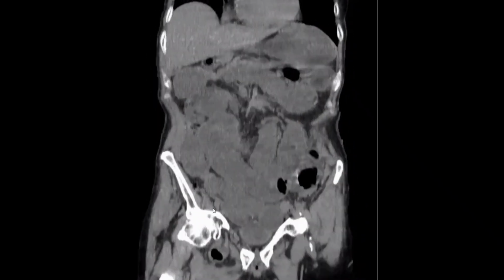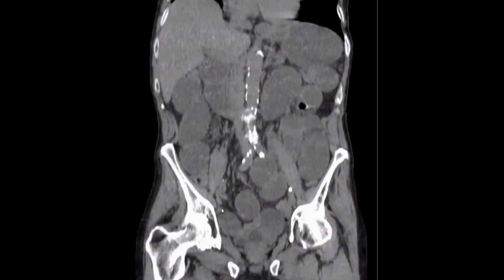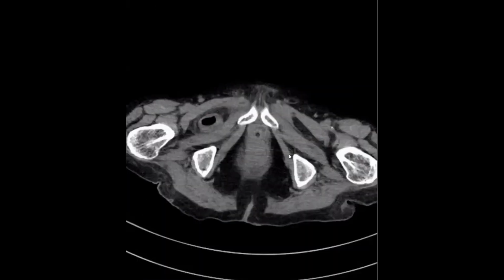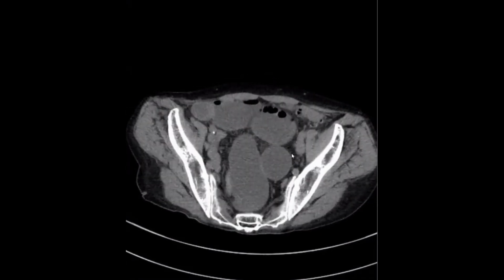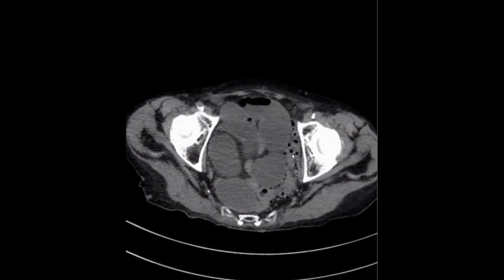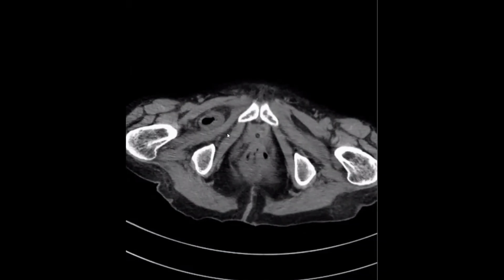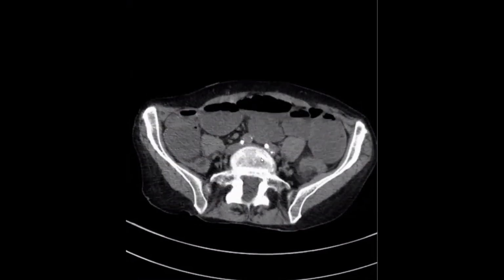So you have here small bowel obstruction and you are searching for any transition point. I think it's difficult in these clumped dilated bowel loops to search for a transition point. Let's go to the axial plane. There is the right obturator hernia. Very nice. We have here a very classic, straightforward case of obturator hernia between the pectineus muscle and obturator externus muscle, and this is the cause of the intestinal obstruction.